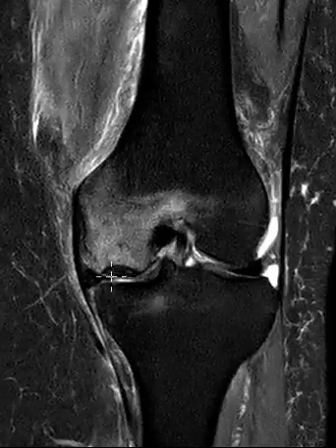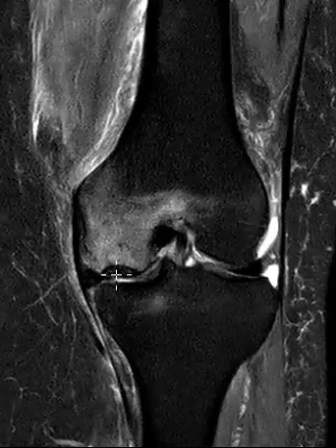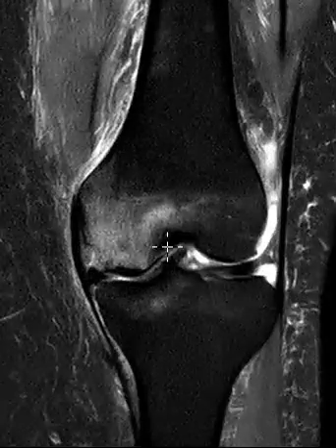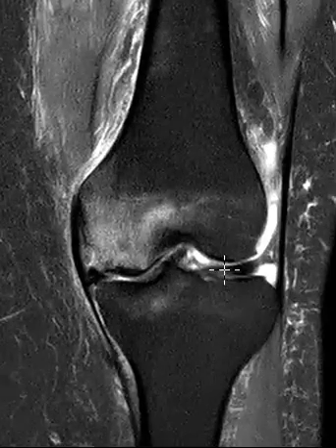We're getting a stress-related injury with marked marrow edema and this impending collapse of the articular surface. So really serious thing to find. And again, a very common type of pattern we see.